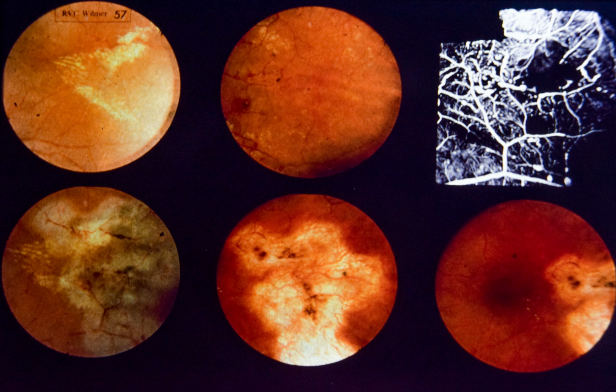Note that abnormal vessels are not seen within the macula. Upper right, fluorescein angiography shows multiple dilated vascular channels, most of which leak dye in later stages of angiogram. Lower left photograph was taken after mild intensity xenon arc photocoagulation was applied to peripheral retinal vascular abnormalities. Lower center, 1 year later, note chorioretinal scars in place of retinal vascular lesions. At the same time, note resolution of macular lipid, lower right. Vision improved from 20/40 to 20/20 and has remained 20/20 for 7 years.